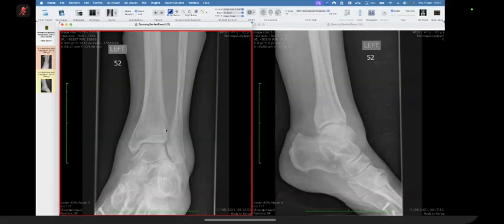So this is actually a genuine case. I'm not kidding. This is a patient of mine that actually turned up in my clinic, had an X-ray done, which was not reviewed properly. I'm not saying it's the easiest X-ray to be done, but it is there. So she came in, she was in a lot of pain. She was literally not able to bear weight. And I looked at her and I said, this does not feel right. Looked at the X-ray and I was worried about something else.